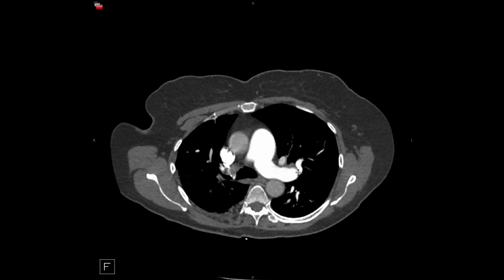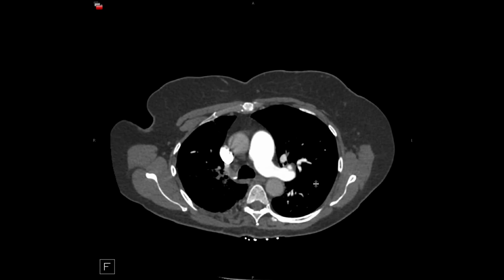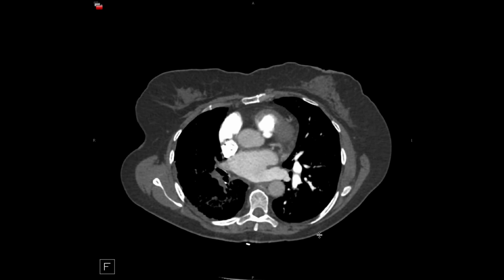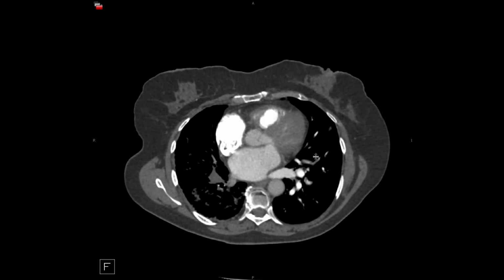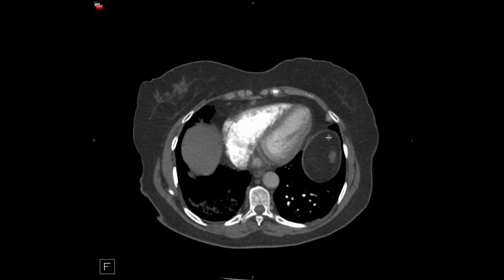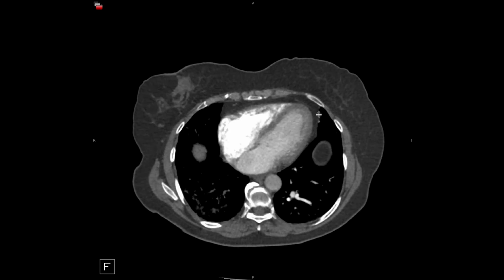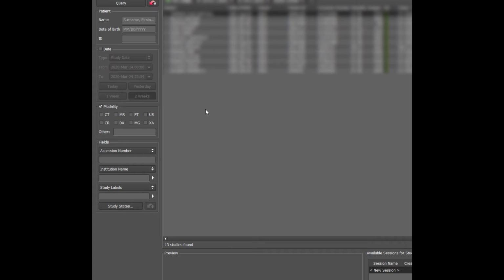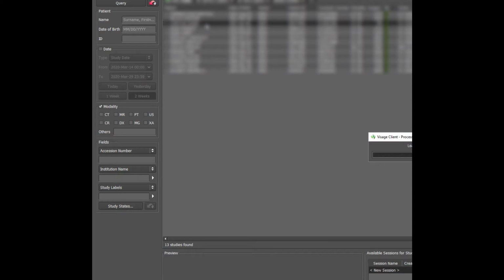Again, you can see some vascular narrowings. This branching point here is obviously very asymmetric, with this vessel being much smaller than the vessel proximal to it. Again, abnormal branching there, suggesting small webs, basically. In this case, the right ventricle is not enlarged, but this patient does have pulmonary hypertension based on echo. And just one more example here.